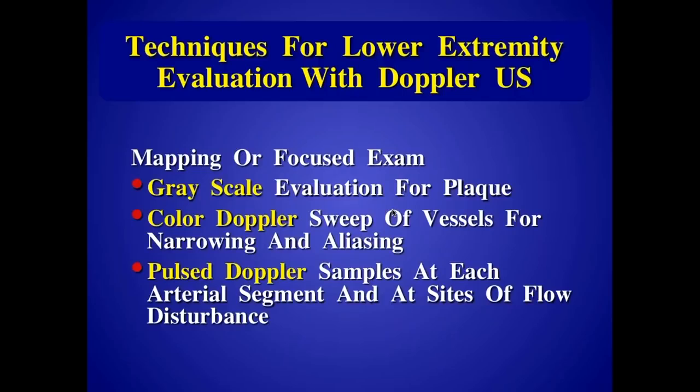So for example, in the study we just reviewed, we saw that there was a focal decrease in pressure and blood flow on the left femoral popliteal side. So if we wanted to do just a focus study, we could just study and take images from the left thigh to the calf.